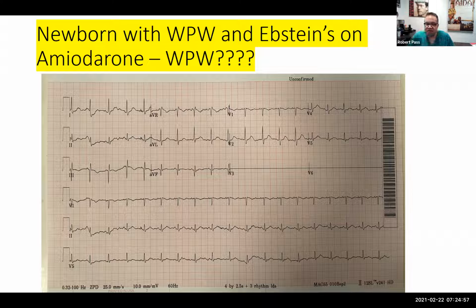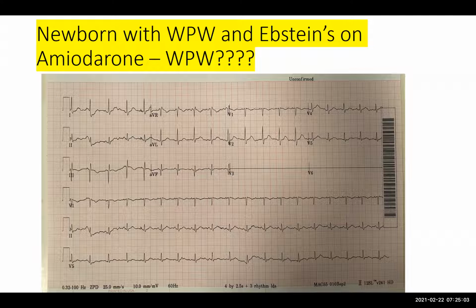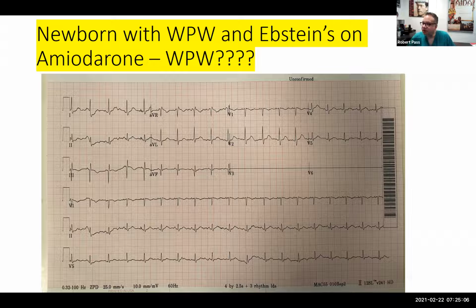But sometimes, particularly with flecainide, you see this with people with WPW, but also with amiodarone. If you see pre-excitation go away after you've been on amio for a while, that's a good sign that there's a hefty dose of amiodarone, and it's unlikely you're going to have SVT, because presumably if you have antegrade block in the accessory pathway, you also hopefully have retrograde conduction block at the pathway. And so the patient is unlikely to have SVT. So this is a nice tracing of somebody who seems to be well treated with amiodarone for WPW. Okay.